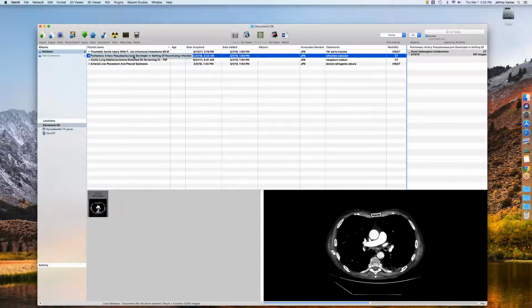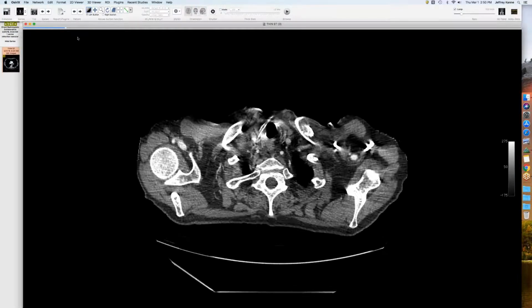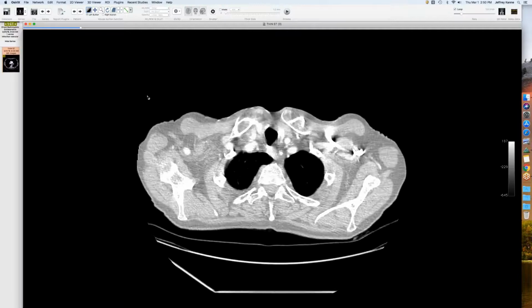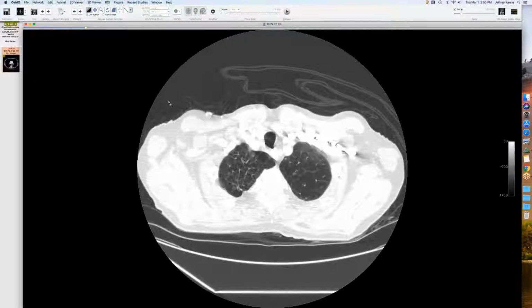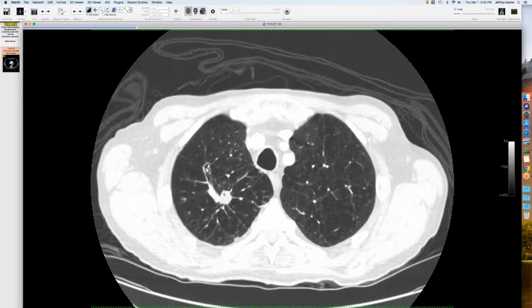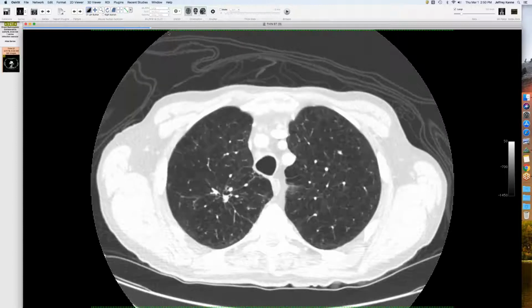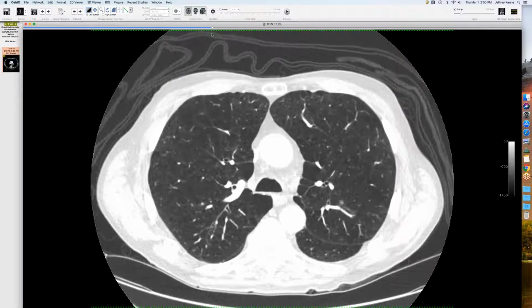Very dramatic. Okay, this is a cute little case. This is a guy who presented with a fever, cough, clinical diagnosis of infectious pneumonia. You can see he's got an old smoking history. This is chronic. He's got this cavity up here, this bronchiectasis, some calcium in it. I don't know if it's old TB or not, but he presented also with hemoptysis.